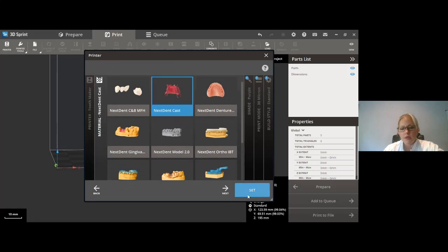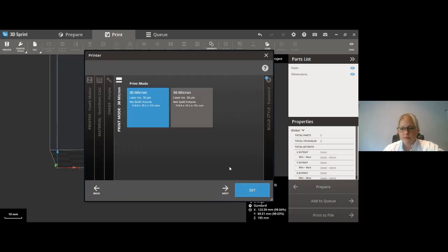Okay. So all you have to do here. Yep, I was on mute, sorry. Yeah, it's right there in the print mode. Yeah, it's included in the update.